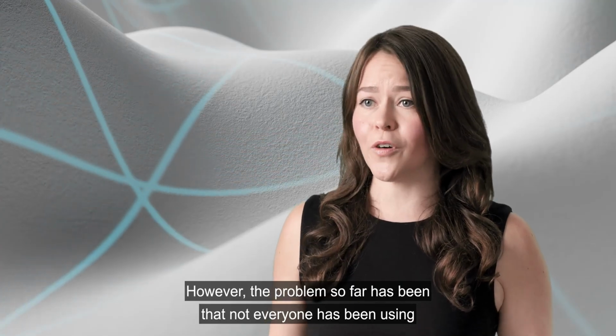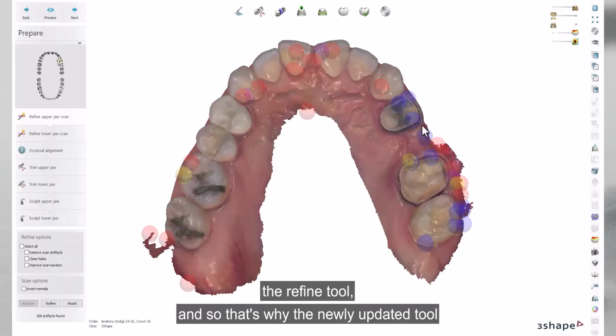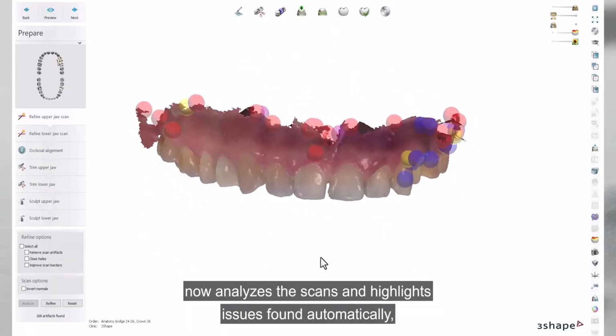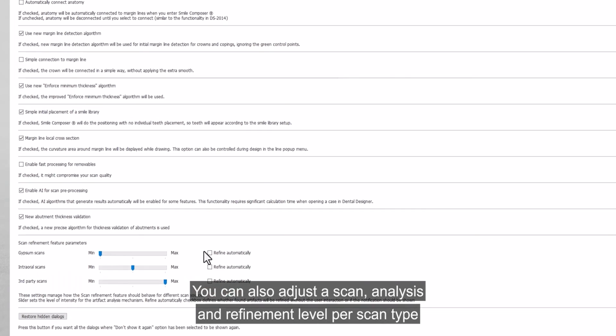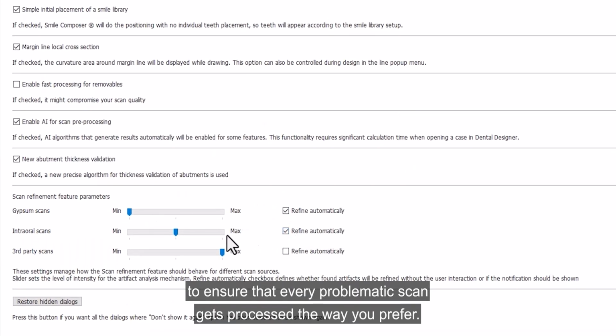However, the problem so far has been that not everyone has been using the Refine tool. And so that's why the newly updated tool now analyzes the scans and highlights issues found automatically, so that you are aware and can choose to refine them. You can also adjust the scan analysis and refinement level per scan type to ensure that every problematic scan gets processed the way you prefer.